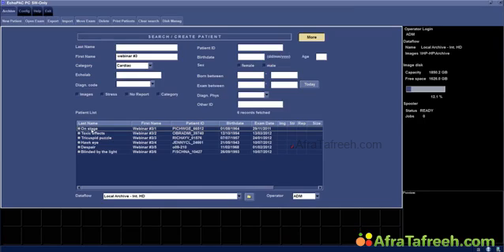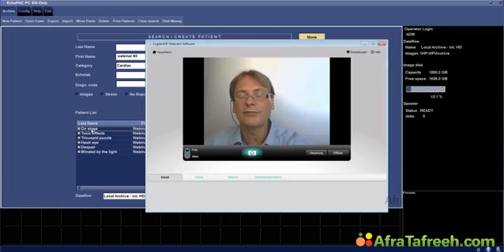Well, actually, no. I think the first case was probably not a case of heart failure with normal ejection fraction. It was a case of left ventricular dysfunction because the patient did have regional wall motion abnormalities, and he had all reasons to have dyspnea because left ventricular function was reduced and because he had elevated left ventricular filling pressure.